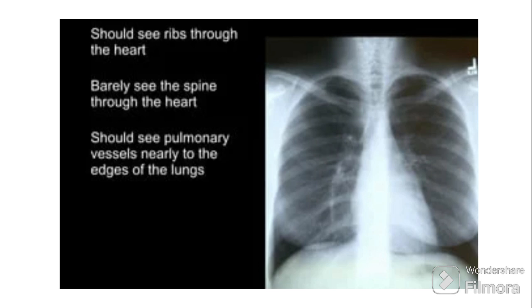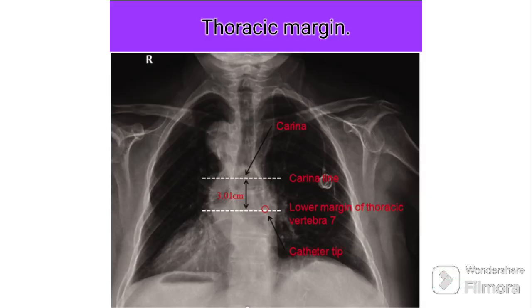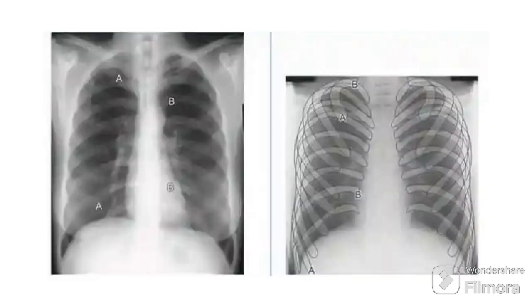If not visible to us, that means this X-ray is hypoexposed. So for adequate exposure, the lower thoracic vertebrae margin should be barely visible. Also, you must be able to see all of the lung zones on the radiograph. If you cannot see them, you will not be able to make a reliable diagnosis.